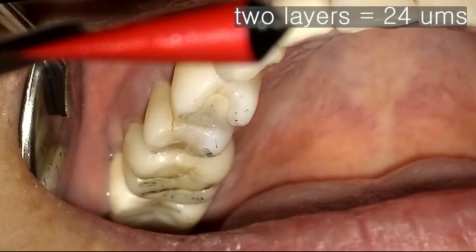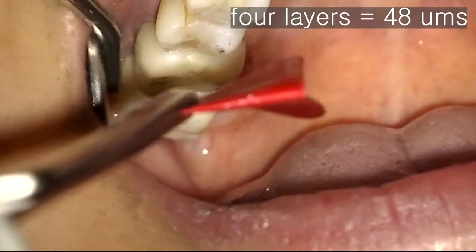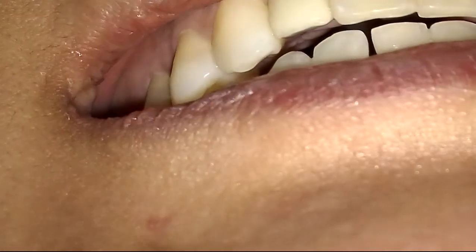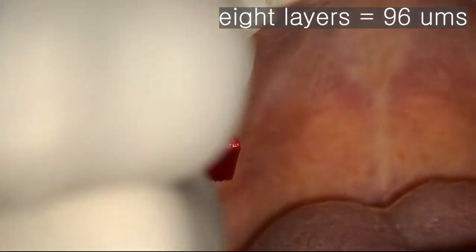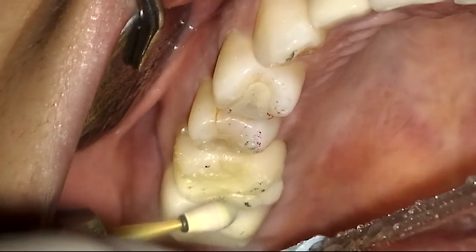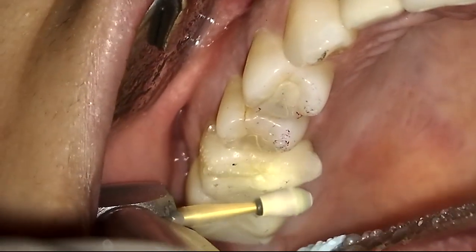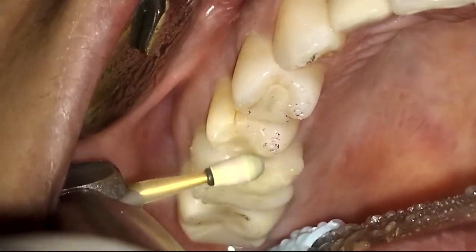Fold it once and it becomes 2 sheets. This also comes out. Fold it again to make 4 sheets. This time it gets stuck but it comes out. Fold it again, for a total of 3 folds and 8 sheets. Finally, it doesn't come out. You can see that it is as high as between 4 and 8 sheets. In terms of thickness, this translates to about 48 to 96 micrometers.